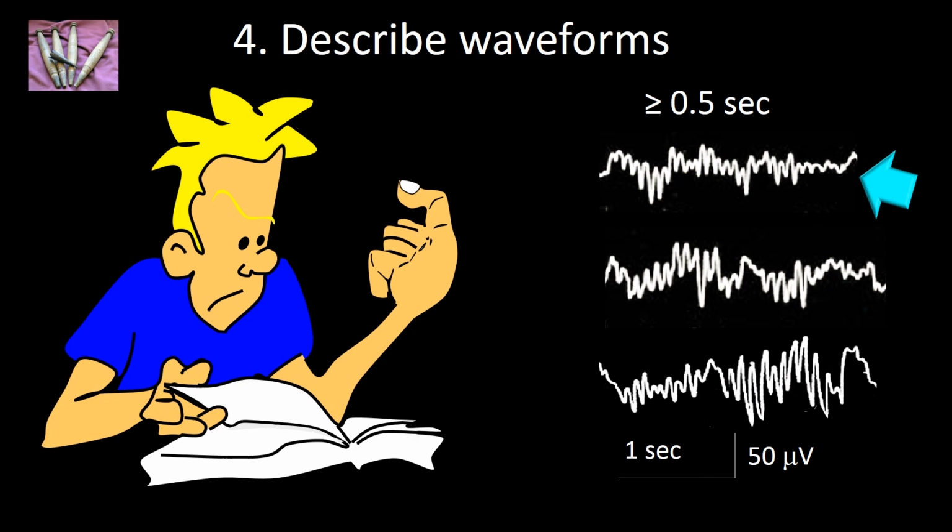They occur in bursts that may have a rectangular envelope or may have a spindle-like envelope, which is the envelope that characterizes and names these structures. These bursts tend to begin and end with lesser amplitude than in the middle. So the lower amplitudes are at the beginning and at the end of the burst.